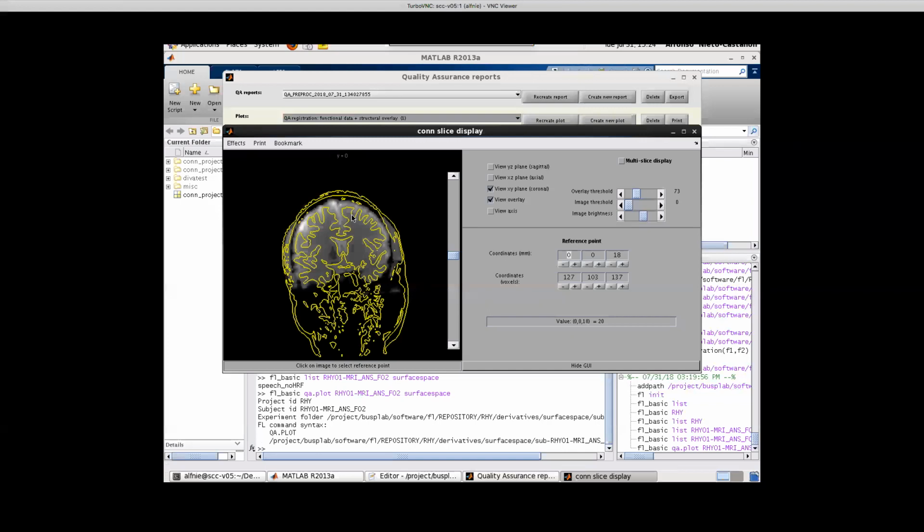So the FreeSurfer T1 file and the FreeSurfer surfaces should be perfectly correlated, but in some cases the T1 file might have been modified and might have lost the correlation between that and the actual surfaces, and if that happens, we don't have an easy way to catch those issues. So for that, I will create those displays that allow you to catch those cases, basically, when the surface of one individual subject doesn't quite represent the anatomical data that it should represent.